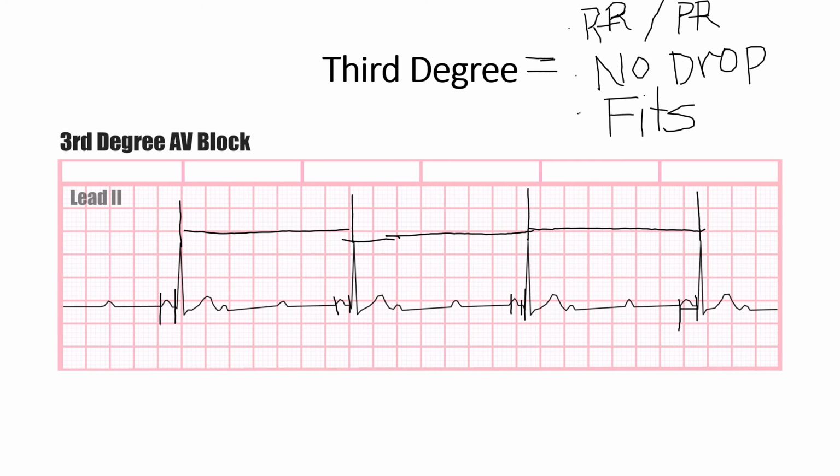Now, it's not directly in the box, but you guys get it. It's also based on the timing of the 0.20 seconds. So if this were to shift over, it would still have enough space around the box, or the time for it to fire, for the PR interval to complete.